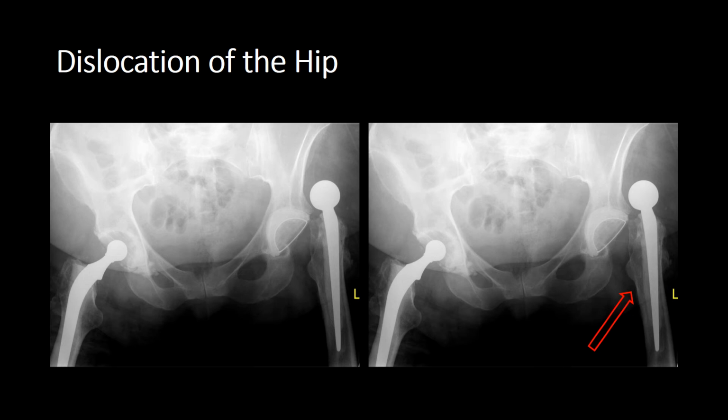The more commonly encountered hip dislocations are in patients who have had a hip replacement and sustain a dislocation of their femoral head and stem. Remember, hemi means half, so a hemiarthroplasty is a half replacement. Patients with a hemiarthroplasty have retained their normal acetabulum, which has not been replaced.